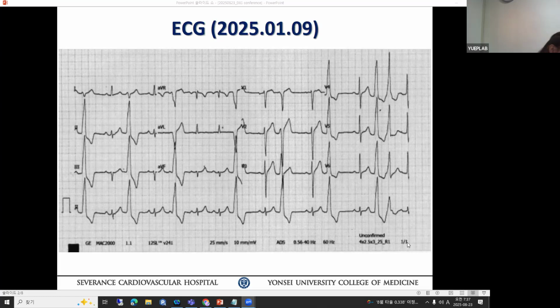So I think we have talked about possibilities, right? What are the possibilities that the PVC is changing? Again, the answer lies in the PP interval. If you look at V4, V5, look at the ST segment. There's another hump in there. Yeah, right there. Just before that. Yeah, that one. Look at V4 also. It's different than the other PVC, slightly different. So that may raise a question: does a P wave fall into that period of time and have a partial conduction resulting in a fusion beat?